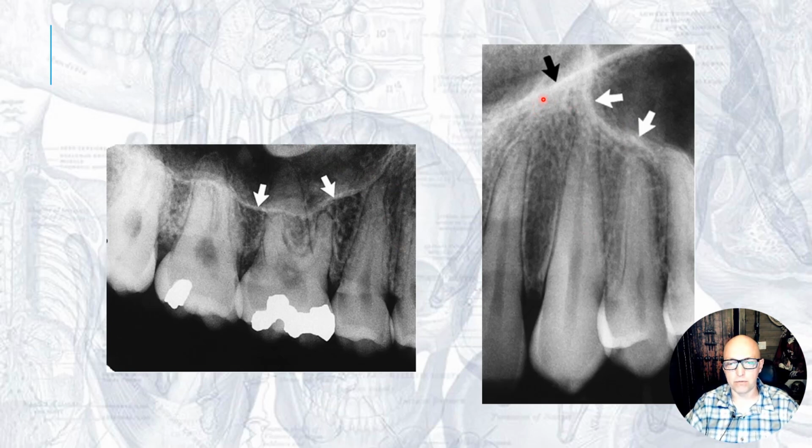All right, as promised before, I said I would show you this inverted Y-line, or the Y-line of Ennis, it's called. So what do we have here? Orient yourself to the radiograph. Canine right in the middle. Nice canine shot. This is an incisor, so this is more anterior, so you should suspect that that line is the nasal cavity, the floor of the nasal cavity. It continues onward, as we showed. In some cases you can even see it in the posterior, but that's rare.